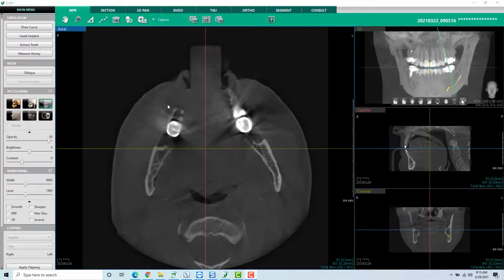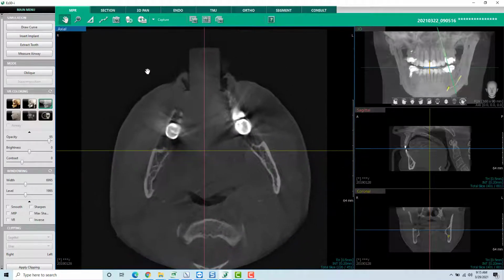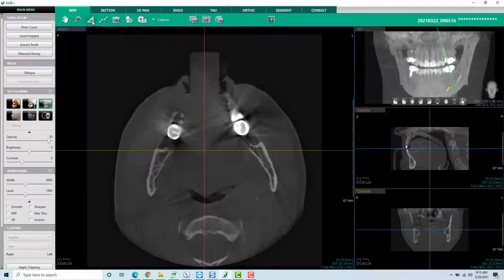I would like to look at a couple other tools on the top toolbar. These icons here are going to be static, meaning that they'll be on almost all of your windows here. The panning tool will allow you to move the image around. The magnifying glass, left click it to zoom in and out. We went through our measurement tool where you left click and left click. To turn these tools off, you right click, and you can right click and delete.